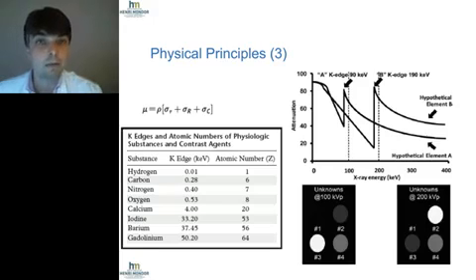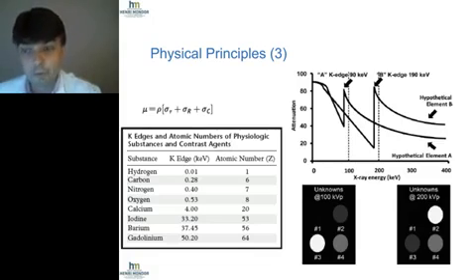What does that mean? That means that in material 2, there is more of a material showing high attenuation at 190 keV than material A. And this is the third important point of spectral imaging: we can reconstruct the images of tube number 2 as a composition of material A and material B.